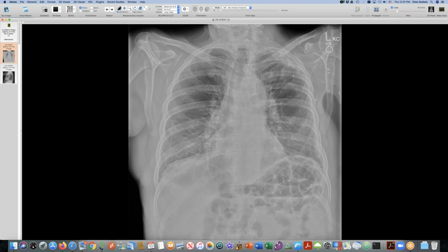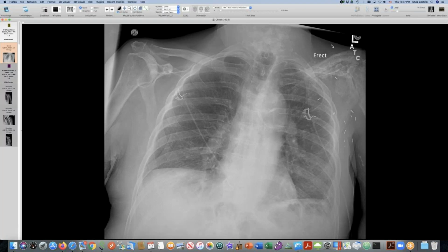Yeah. Now, I don't know about you guys, but I still see sclerosis in the ribs and sometimes the clavicle in patients who get radiation for breast cancer. I don't see a lot of the necrosis, it's more like an osteitis, but I do see a little bit of sclerosis in those bones. So I think even with the modern techniques, they still get a little bit of abnormality. Right. Yeah, and you'll see fractures too. Well, you can see a little bit of peripheral lung fibrosis. So the ribs that are included in that field might be affected too. Yeah.